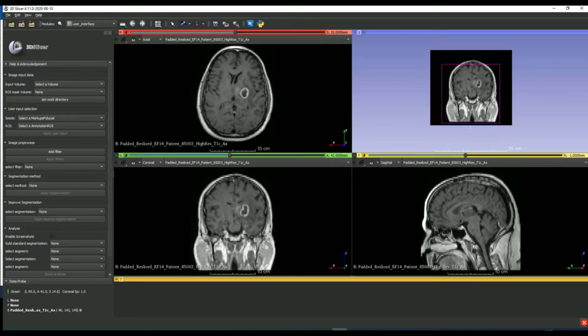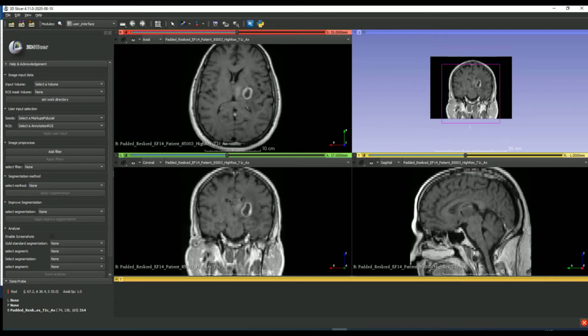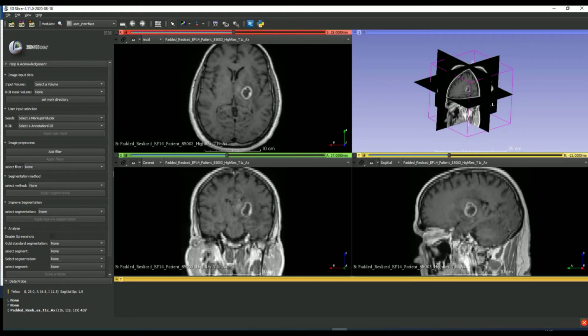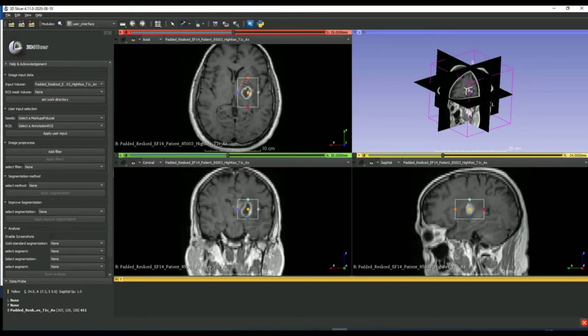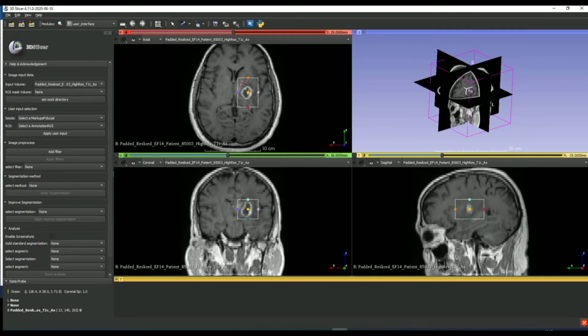So first of all, I loaded this image into the 3D Slicer environment where my module is implemented. As you can see, we can zoom in on the tumor and understand the exact location where our region of interest will be. First, we'll load the image into our model and select the user input data. There's two types of user input data. First is a seed. We can select here two seeds for the watershed algorithm we want to implement. And the region of interest allows us to process only the area we are treating or segmenting and not waste processing resources on other areas, on other regions.